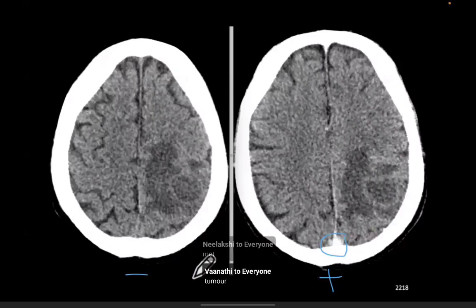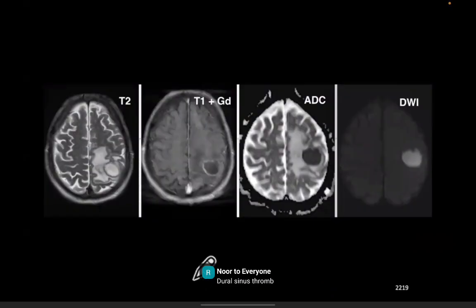You don't know whether the patient has got an abscess or metastases. The history is a bit vague. Do they have a temperature? No real way of knowing. So the patient has a T2 weighted MR, which just shows lots of vasogenic edema.